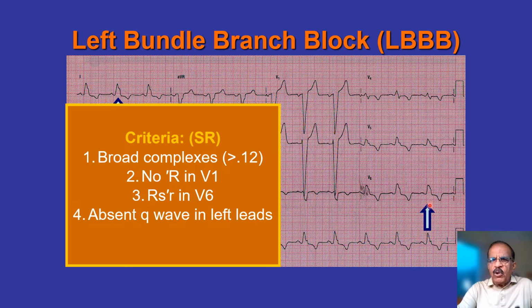It doesn't go below the baseline. A true S wave actually goes below the baseline, but this one which comes down doesn't even reach the baseline. It should still be called S wave because of the second rise, which is R prime, the second one after that initial indentation. So this, technically speaking, is an RSR pattern in V6. So this actually fulfills the criteria.